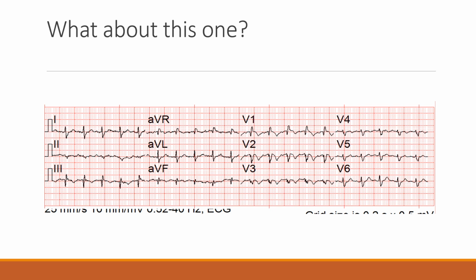So when I'm looking at this, I have an orthostatic syncope patient with tachycardia, I don't see STEMI, I don't see any major things, so whatever. This is probably just dehydration, right? And so I think a lot of people would go, I'm going to just give this patient a large fluid bolus. But the crew saw something here that I think matters. It clearly matters because it made a huge difference in the care of the patient. So they noticed that V1's QRS is up. Now remember, what is V1 supposed to be?